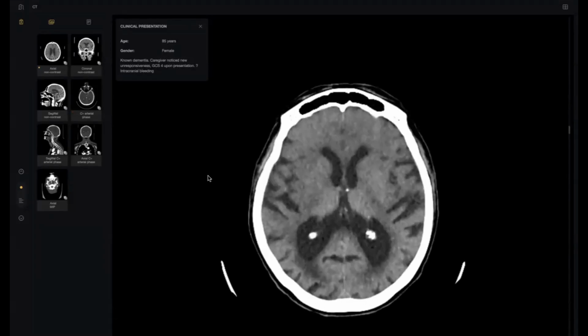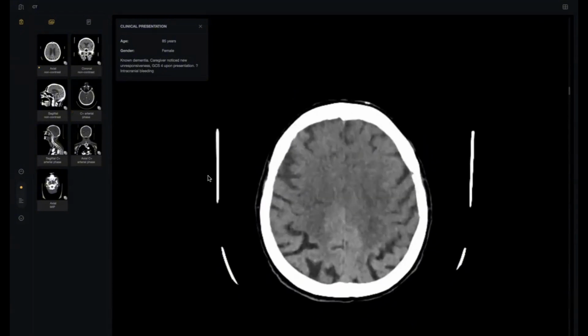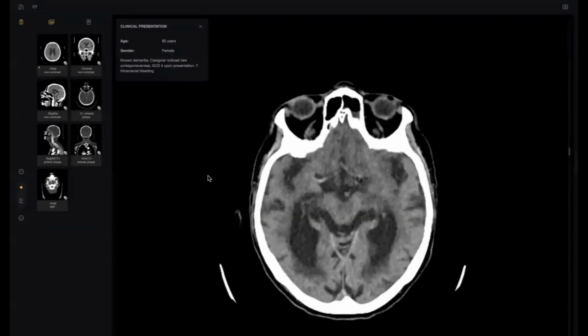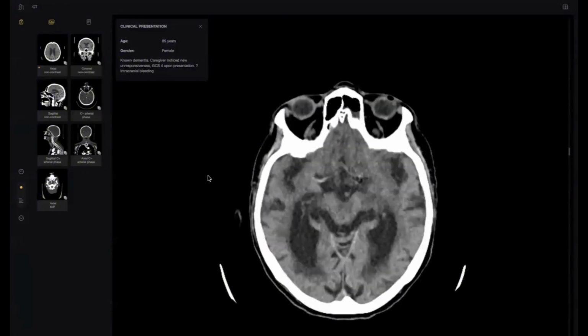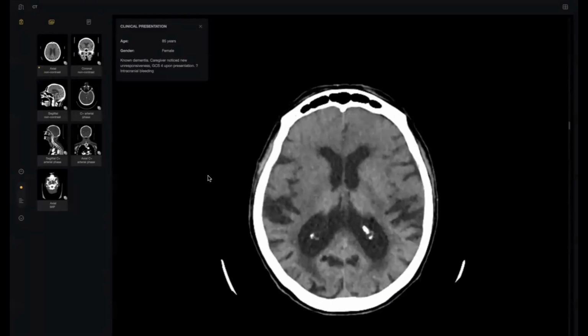I can see that the patient had right internal carotid and vertebral artery thrombosis, arterial thrombosis. So not bilateral, doctor. Right-sided, yeah. So the patient might have AVMs causing thrombosis.